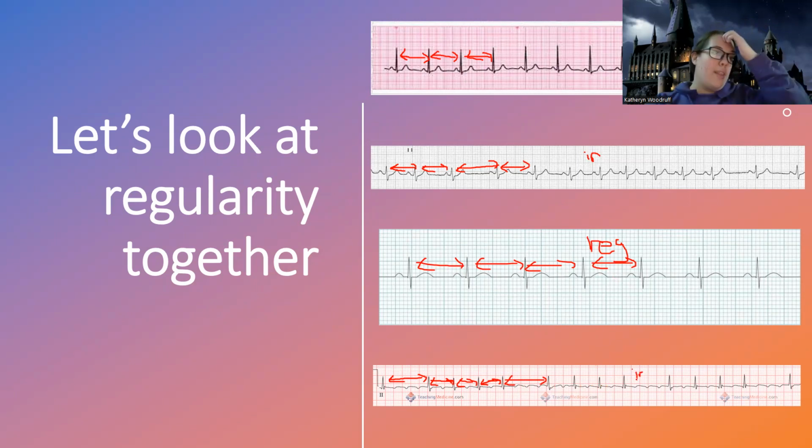So these are all just little steps and we're getting practice doing each of the little steps. And then at the end of this, we will bring it all together. How do you take all these steps together and look at a rhythm? But that's all about regularity.